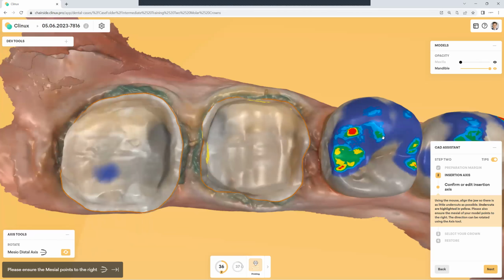You can see I pulled in a little bit at the gingiva. Watch how I fix this. I'm going to go in with the smooth tool, believe it or not, and bring this down a little bit. You can see this little deformation that happened near the margin. I'm just going to put the smooth tool on this, and this relaxes that surface and brings that concavity out. You see that? Now I've smoothed that all out, so that's going to be easy to clean for the patient. No worries, no issues there. Okay, so our proximal contact is done.